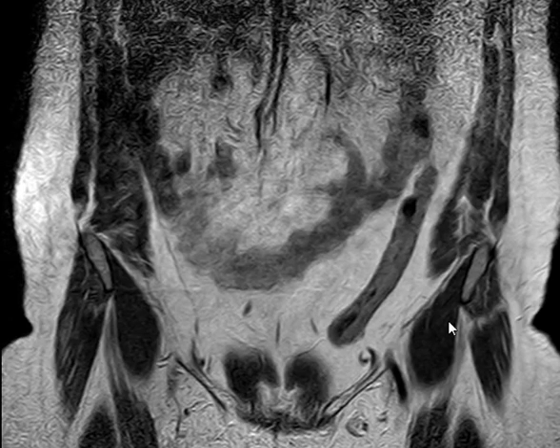In the left adnexa, or mainly in the midline, there is a rounded hypointense signal with some small hyperintense signal at the periphery. Then I will see this one. This is the same one. Yes.